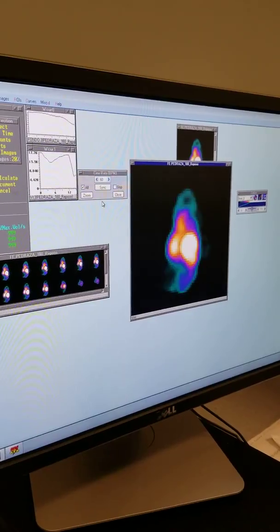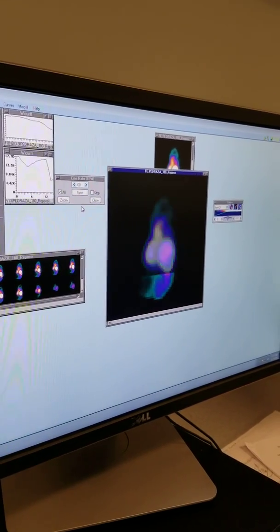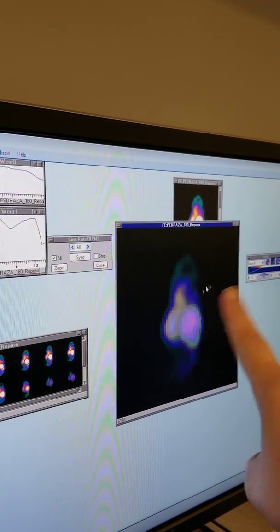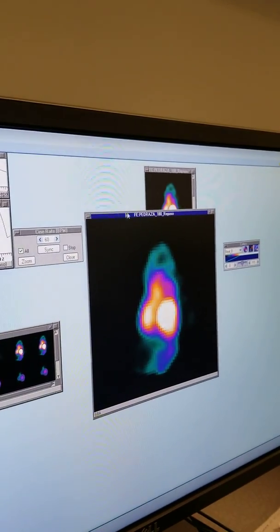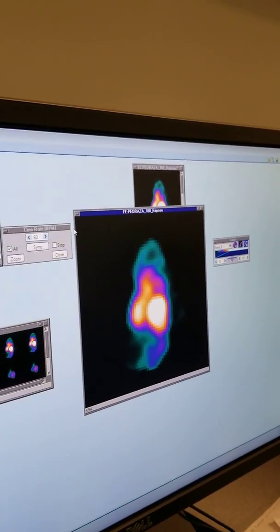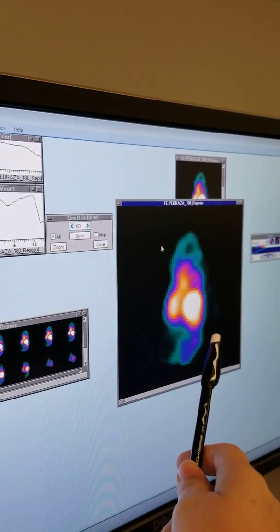On your grading rubric, the last couple of steps are regarding your cine. So your cine is your moving one, right? Your moving one has been hanging out up here in the background. See it's beating? Cine, movement? Yeah, that's the one. You're going to select it, make sure the top bar is blue there. We've clicked on it, that's our active one. We need to do 2 things. We need to make it big. The down arrow does not work for this. You have to hit the zoom button. So zoomy.